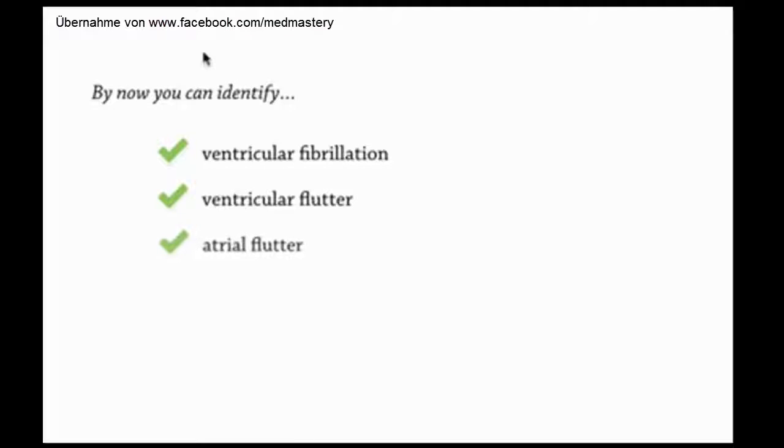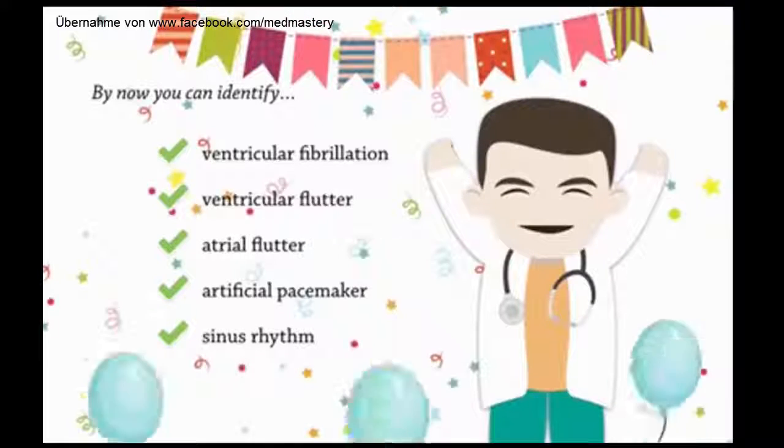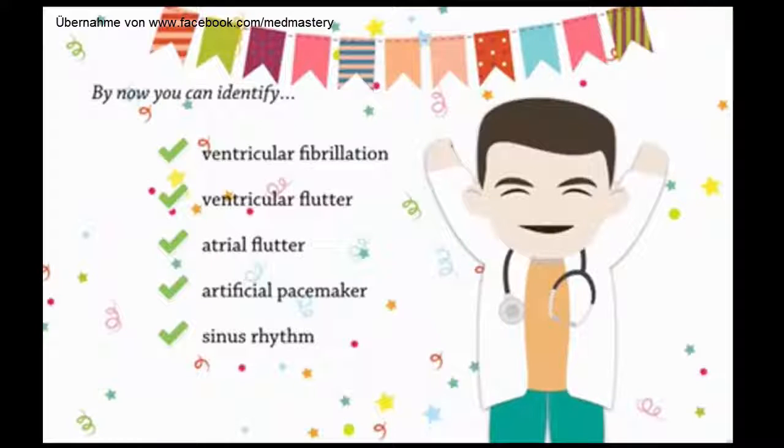So congratulations! By now you can already identify these disorders: ventricular fibrillation, ventricular flutter, atrial flutter, an artificial pacemaker, and, of course, sinus rhythm. Now, let's check out some exercises.